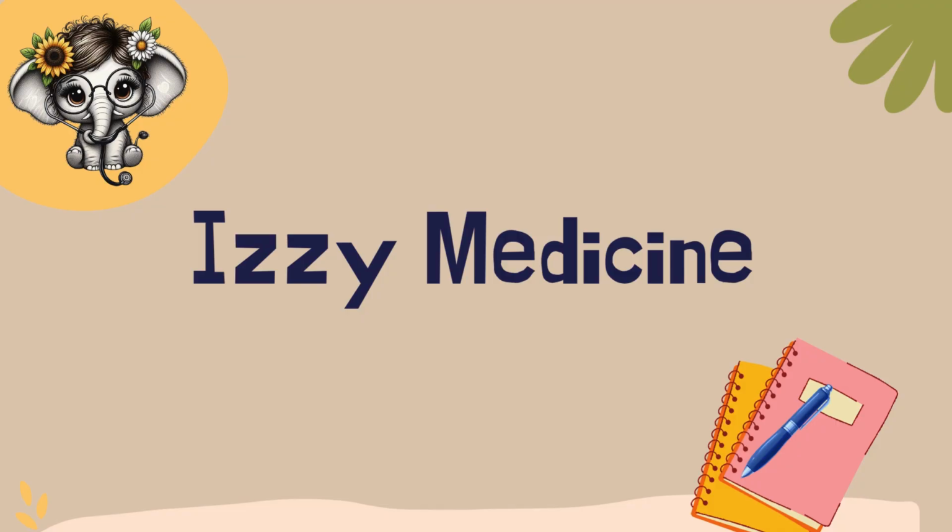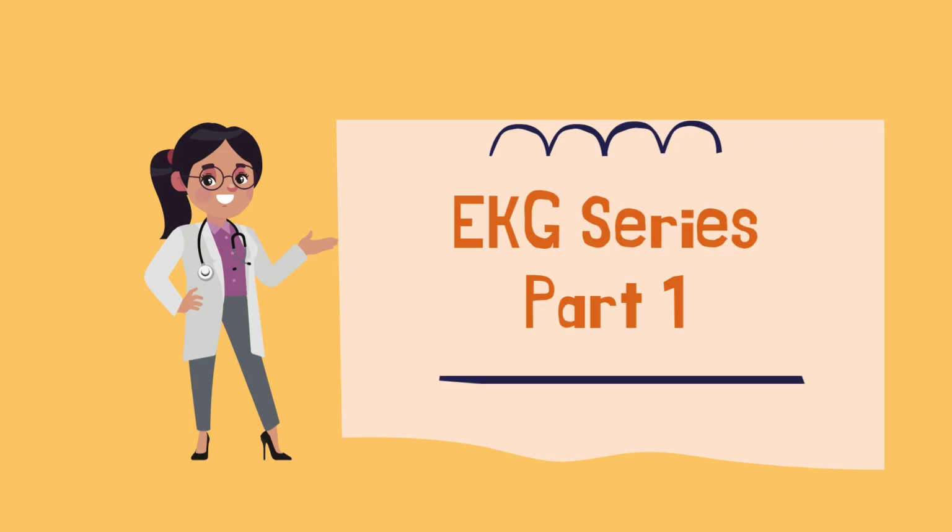Sense of them. Today, fittingly enough, we're going to try to learn how to read an EKG. And we're going to start with the heart's electrical system. We're going to talk about the SA node, the AV node, the bundle branches, Purkinje fibers, the whole shebang. And then we're going to learn step by step how to read an EKG.